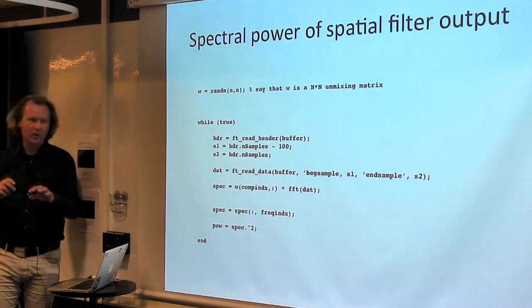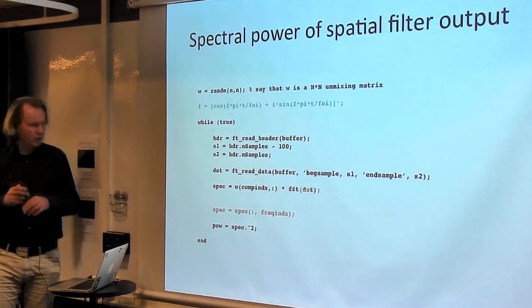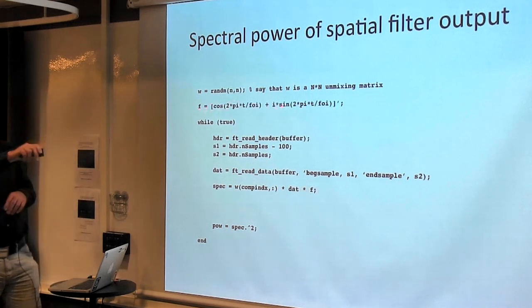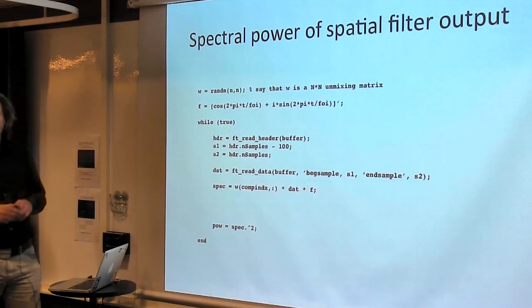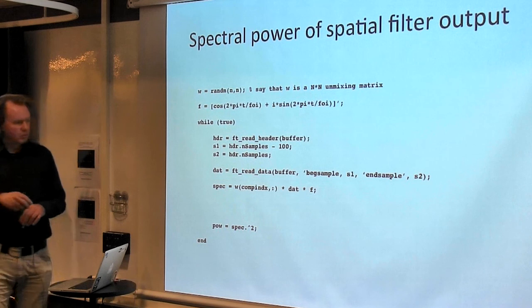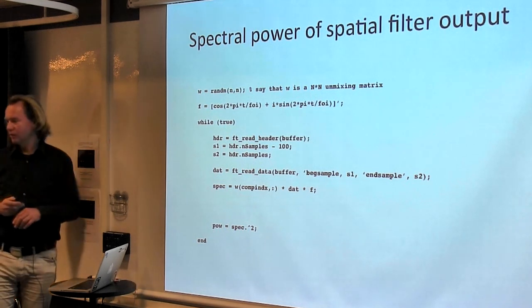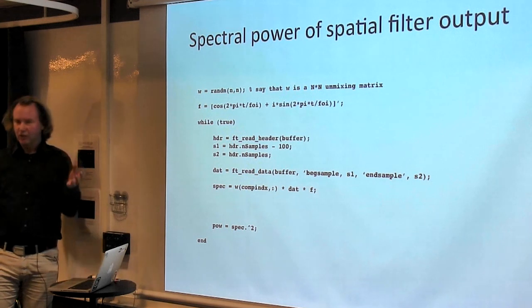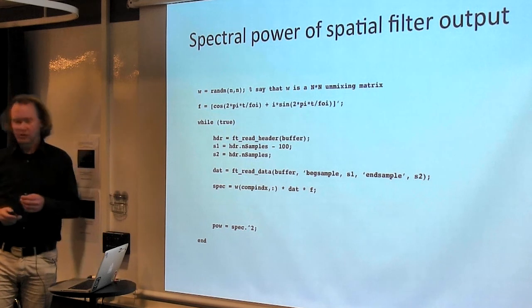I explained this morning that a fast Fourier transform is very similar to linear regression. So what I can do is give my regressors here, and I can do a GLM on the fly, just computing a discrete Fourier transform. So this is really much faster than the previous implementation. Depending on the number of channels and the sampling frequency, it can be like 1,000 times faster.